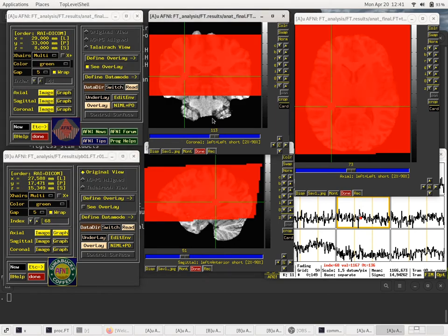If we turn this on, what does it look like? Well, great, a big rectangular blob, so that's pretty useless, right? No, not really. How do you get this? If you take an EPI volume and it's gone through registration steps, and these are all affine registrations, so it's all shifts, rotations, and stretches. That's all that has been applied to this. So basically, this ought to look like a shoebox sitting on top of the anatomy. It could be at an angle, but it still should be a shoebox.